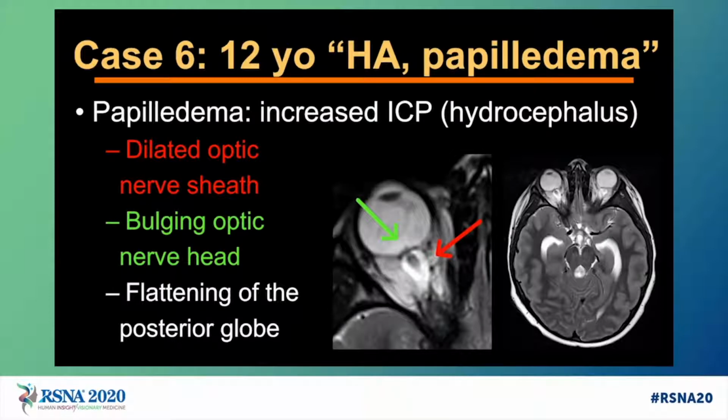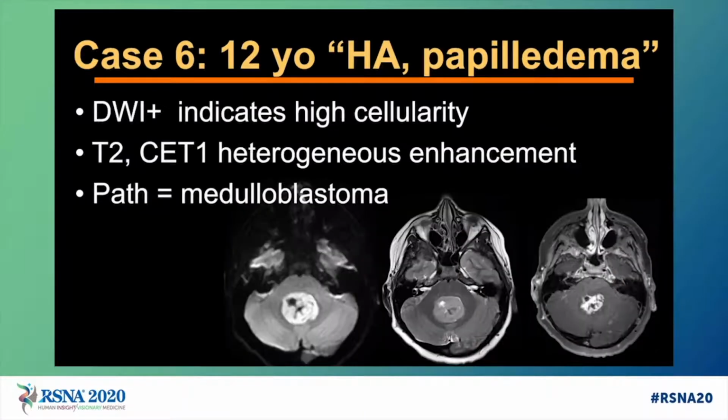Sometimes all you'll see is flattening of the posterior globe. Now, of course, we wanted to know what was causing the hydrocephalus, so here are some images through the posterior fossa.